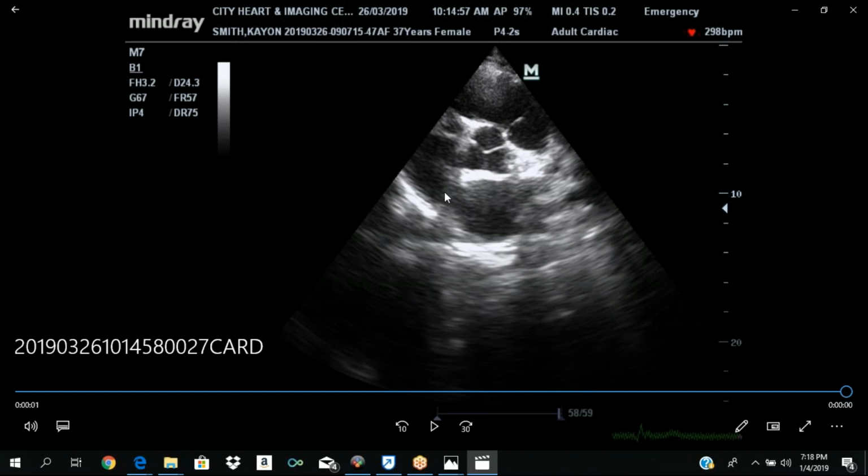If you remember what we told you in the anatomy session, your non-coronary cusp is adjacent to the atrial septum. Okay, because they're going to ask you to identify stuff in the exam, and if they ask you what cusp or valve this is, it's a non-coronary because it's adjacent to the atrial septum. Then this is the right coronary cusp, and this is the left.